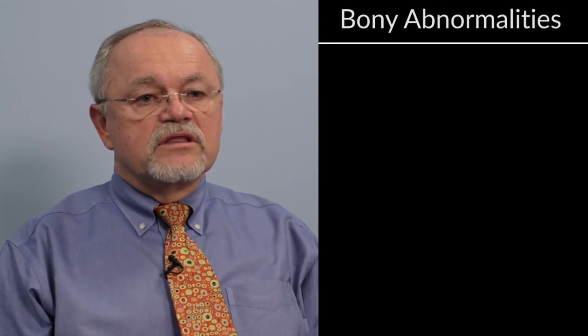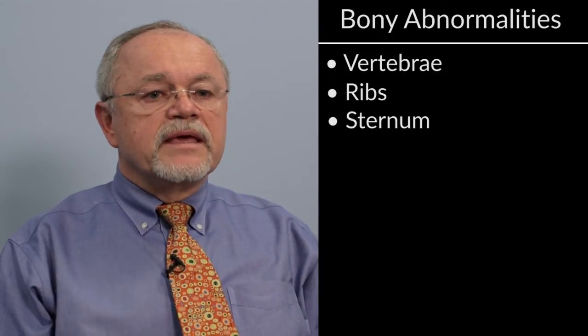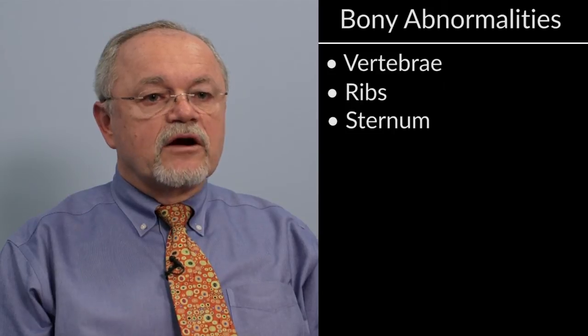Bony anomalies are also very important to pay attention to because they can be signs of underlying heart disease. And here we need to focus on the vertebrae, the ribs, and on occasion the sternum, because sternal abnormalities are often associated with cyanotic heart disease.